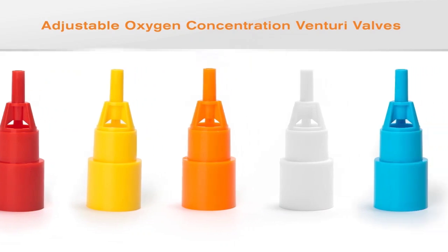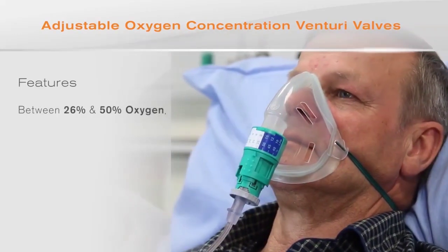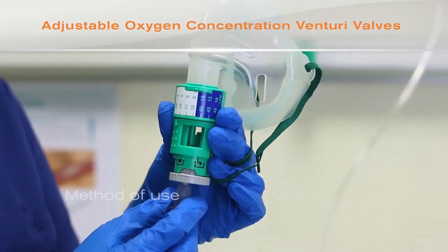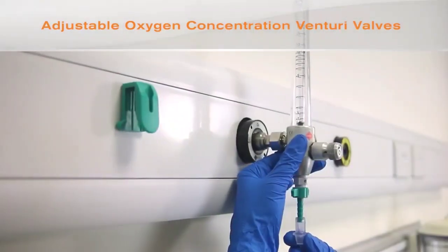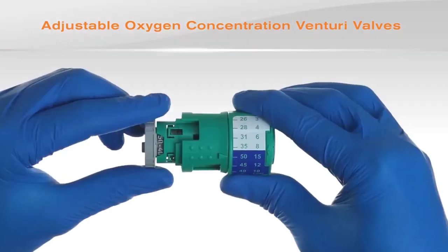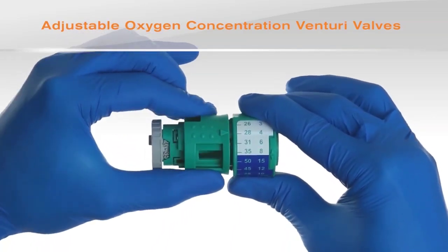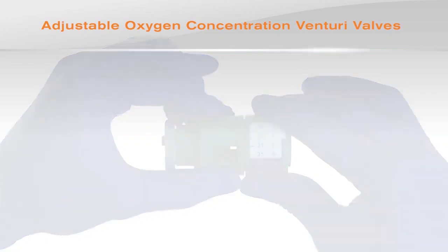The Silente adjustable Venturi can be set to concentrations between 26 and 50% and incorporates a twist-lock mechanism to prevent inadvertent concentration changes. As with a fixed valve, attach one end of the oxygen tubing to the valve spigot and the other end to the oxygen flow meter. To select the desired oxygen concentration, ensure the range selector sleeve is in the appropriate position. If the desired concentration is between 26 and 35%, then ensure the oxygen range selector is set to 26 to 35.